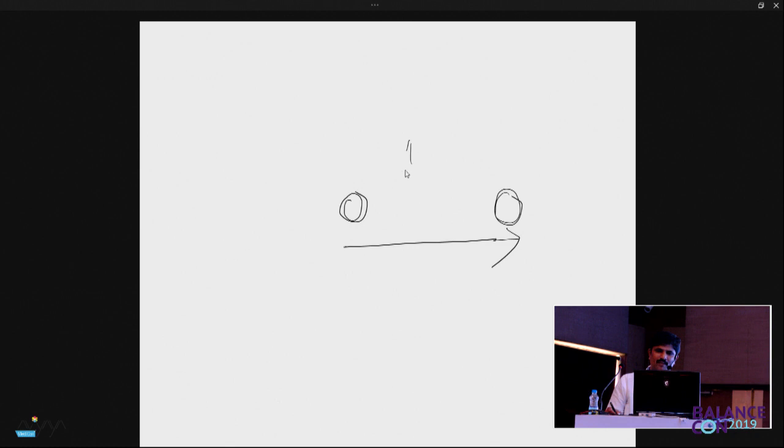So what will happen if this is 1 meter? Just say this is a 1 meter distance, an arbitrary number. If it is a 1 meter distance to be covered, how many ever degrees of arc it is depending on the distance. If the person is underestimating, say he is underestimating by 10%. So instead of covering it in one go, what does he do?